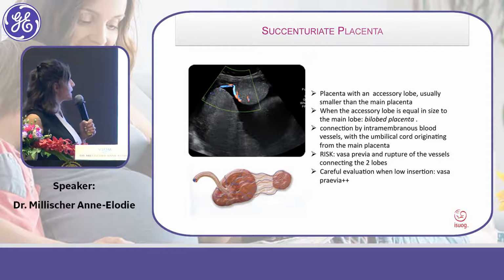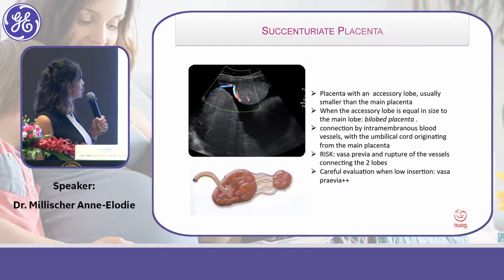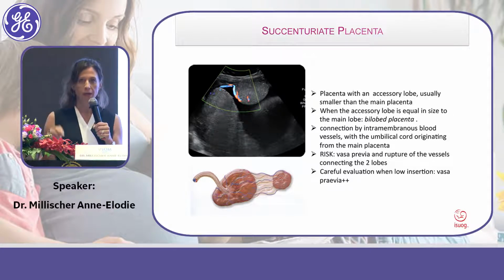Just to notice that the definition of bilobed placenta is just a succenturiate placenta, but with two equal lobes.